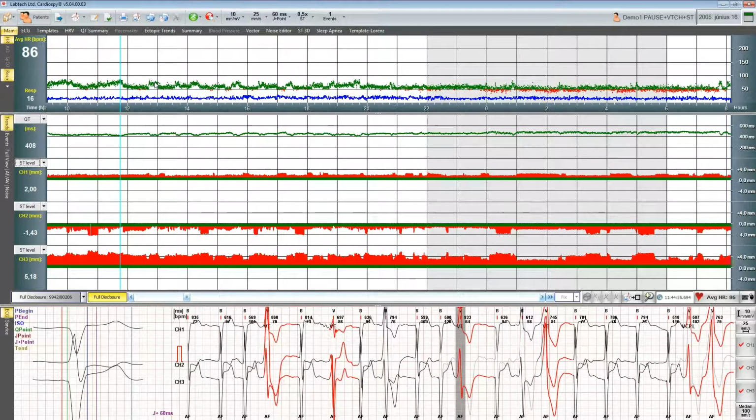I would also like to talk a bit about how you can practically organize the workflow of analyzing a recording, like what to start with and what is good to do second. And we have a function for that. On the top of the window you can see a toolbar where you can go back to the database, print the results, manage your settings, or even get help from the user manuals.